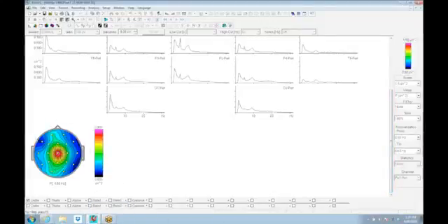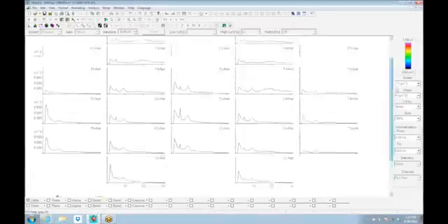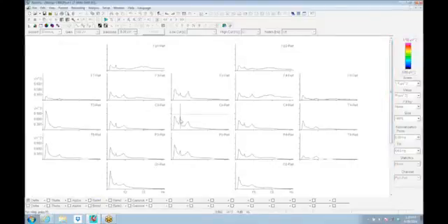And I just want to step back for a second and explain how Jay got that map to happen. Displays can have a lot of change. And as you saw, when he clicked on a particular point in the spectral, you got your crosshairs there. If you then right-click on your mouse, it will... Okay, down at the bottom.